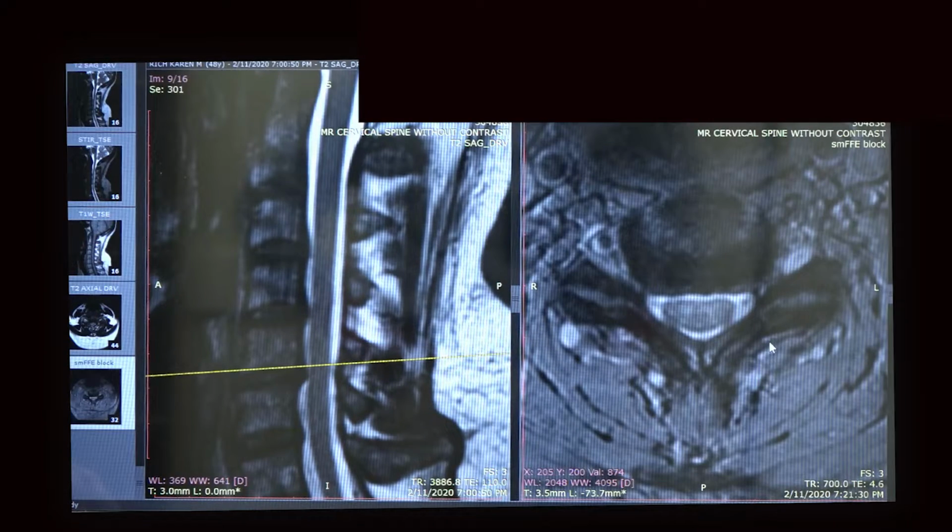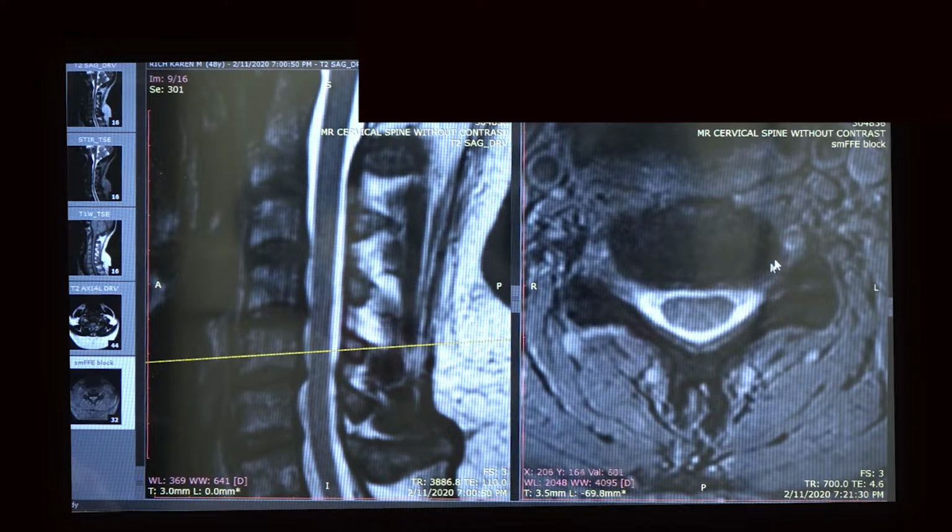In this particular situation, this patient, depending on the clinical findings, I would have to see about the strength in her deltoids, in her bicep muscle, the reflexes, the brachioradialis reflex, the biceps and the triceps reflex, and to see if they have weakness in their wrist, weakness in the grip. I would have to see what is the situation with the sensation, whether there is numbness on one side. I would anticipate, because of this pressure of this nerve root outlet here on the left side, that she's going to have a significant numbness along the left hand, the base of thumb and the index finger. And if that's the case indeed, then I would recommend that she have an artificial disc replacement here.